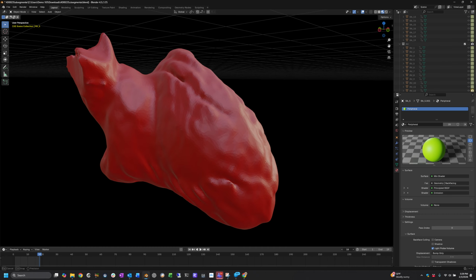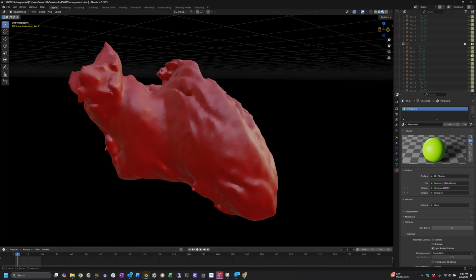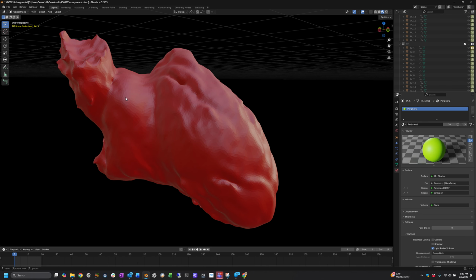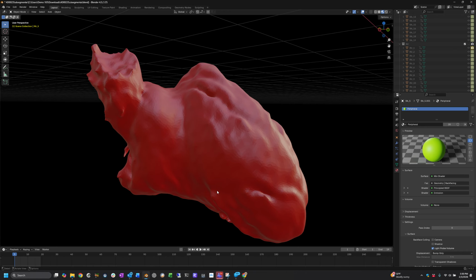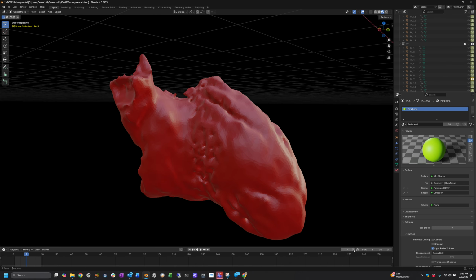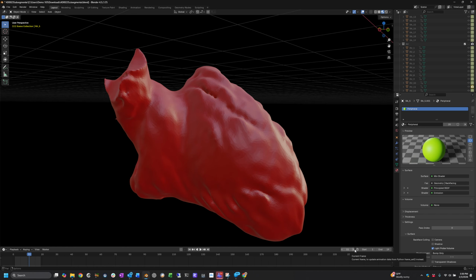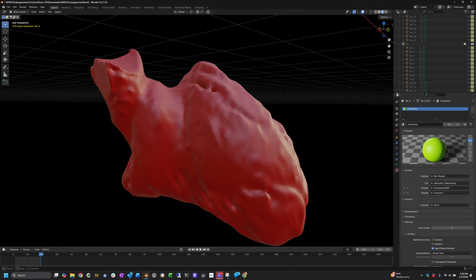If I go back to 1, just so we start in the same spot, playing it through, we can see that there is some variability. One thing I will note is that the method by which we're cutting this out looks pretty good. We had 2 different people performing segmentations, and they were random, so we got a good sense of how well that performs by teaching the same method across both people. Here in diastole, it's pretty much the same.